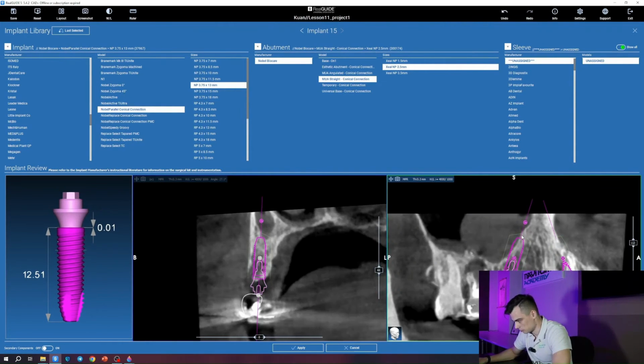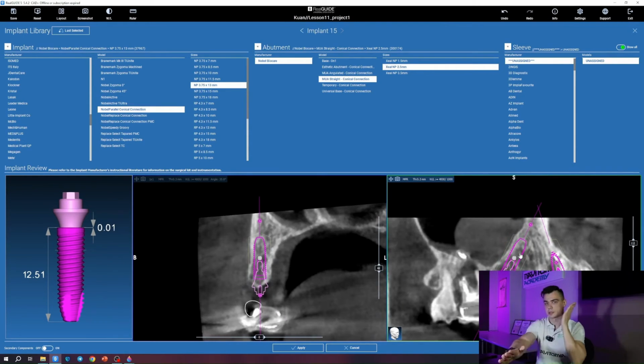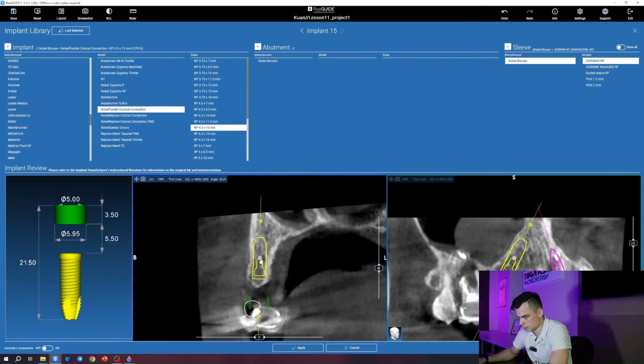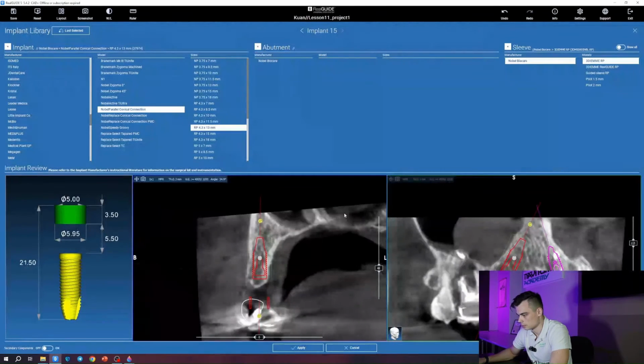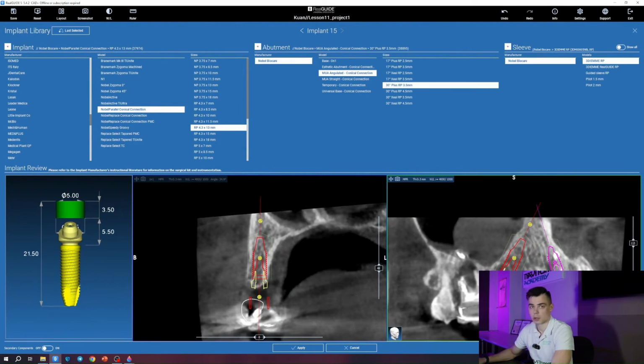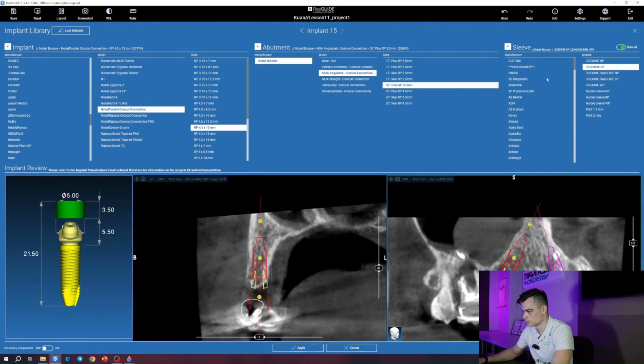So here it is, the sinus. And tangential to the sinus, as if an arrow is just touching it, we place the distal implant. We could probably even use a slightly larger one. And in addition, let's also place, that's just the software warning me that the sleeve is hitting the anatomical model. Let's go ahead and place an angled implant at 30 degrees with the idea of bringing it out to the premolar. I mean the implant channel.